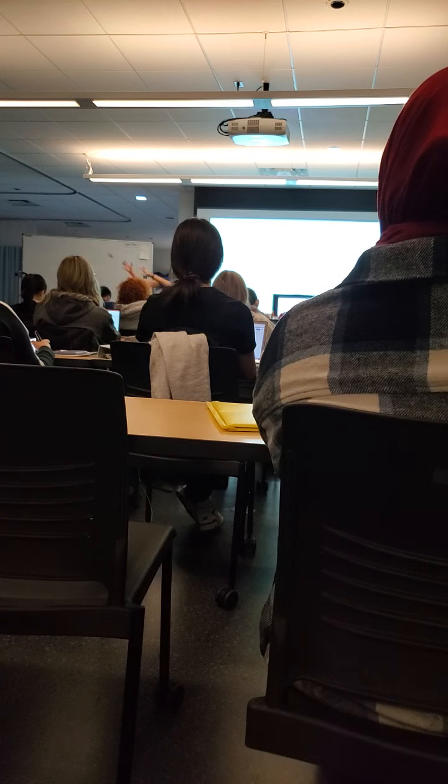So, depending on my area of biliary dilatation, right now we're talking about mostly extrahepatic. So proximal is towards the liver, distal is towards the pancreas. I have proximal obstruction towards the liver, or distal obstruction towards the pancreas, because that's the way our biliary tree runs: liver to pancreas. Extrahepatic ductal dilatation is going to be our common bile duct, anything outside of the liver: the common hepatic duct, the cystic duct, the gallbladder itself, and the common bile duct down to the ampulla.